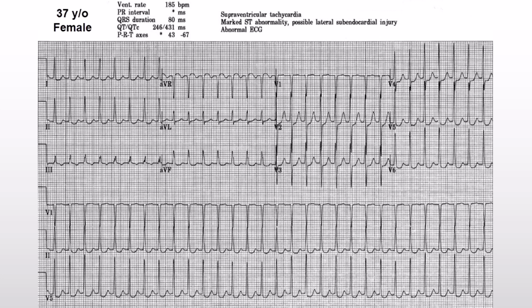But AVNRT is much more common than AVRT. And fortunately, both respond well to the same treatment. Therefore, I would diagnose this ECG as AVNRT and treat the patient appropriately. But what if I'm wrong, and this is really AVRT? Well, I just treated AVRT appropriately.